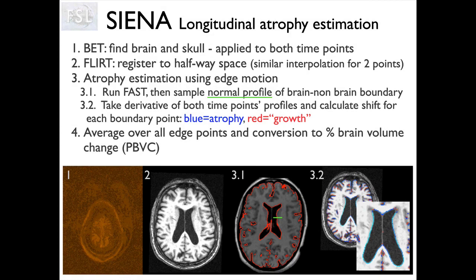So it's going to do a brain extraction in the same way that we're familiar with, but also with a twist. It also estimates the skull from the brain extraction. And that's important for us to get really sensitive estimates longitudinally, because we can use that skull in order to constrain the scaling when we register the baseline to the follow-up scan. And the reason that we're concerned about the scaling is that scanners can drift in terms of their calibration.